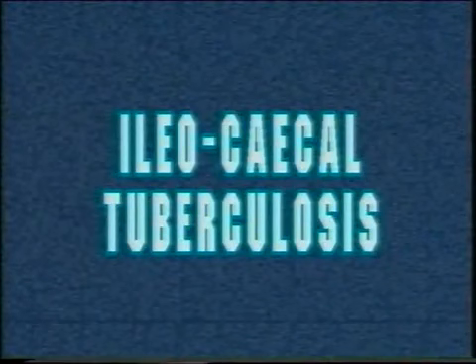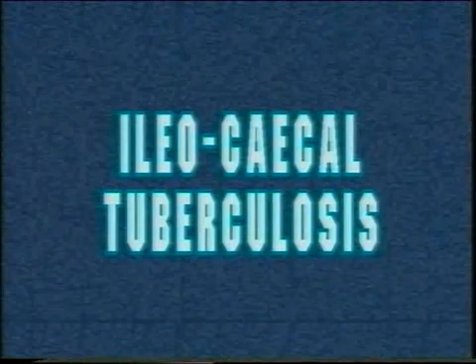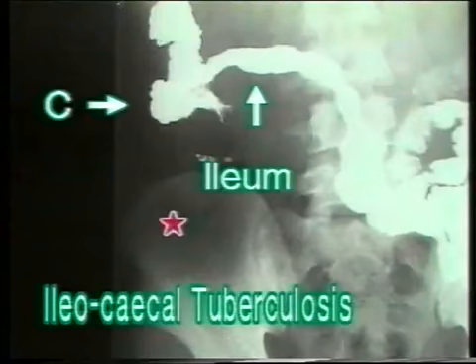Ileocecal tuberculosis is a common cause of pain and lump in the right iliac fossa and often an intestinal obstruction. This X-ray shows a contracted conical cecum which is pulled up due to fibrosis of the mesocolon to a much higher level from its normal position indicated by the red star. The terminal ileum is narrowed, termed as the Stierlin sign, and the ileum proximal to this narrowed segment is dilated.